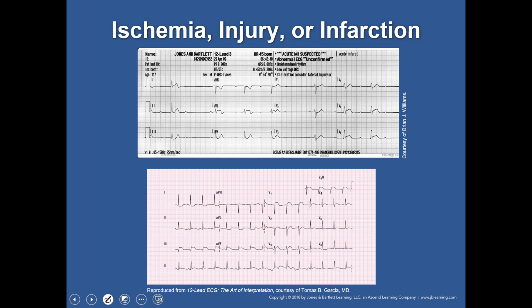Here we go. Let's go ahead and mark it up. Sometimes you can just do that if you'd like to. There's that. There's that. And there's that. So, let's take a look at each one. Oh my, that ain't good. I mean, really slow rate as well, isn't it? So, got an elevation there. We've got elevation here. What about 5 and 6? Oh yeah, we got elevation all over that.